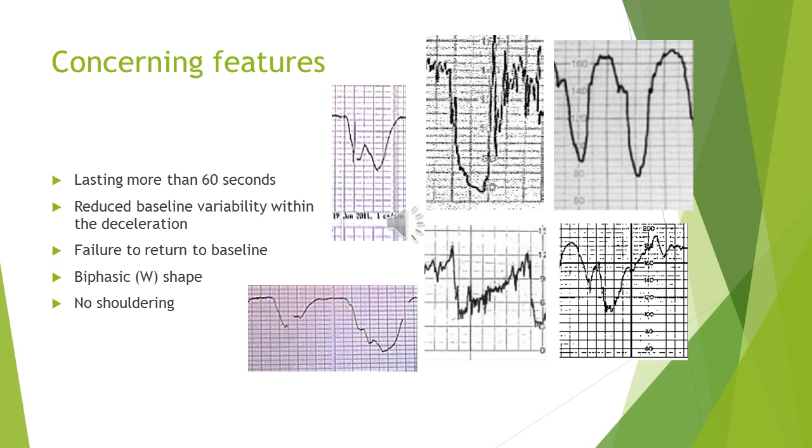So here you have to differentiate. Is this shouldering absent from the start, or was there shouldering and then it disappeared? If there was shouldering and then it disappeared, this means that the deceleration starts to be concerning. However, if there is no shouldering from the start, this means that you can ignore this feature.